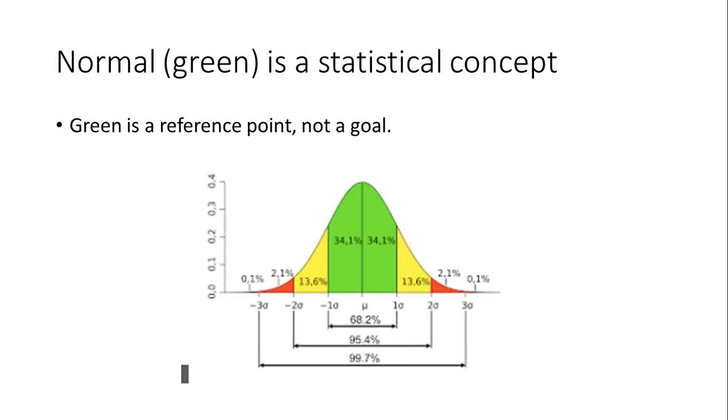We were following BrainDX's example, and we did that for a reason, because BrainDX will be available on our system, and we knew that since the beginning of the system. So this fall you'll be able to access BrainDX norms, which is kind of the gold standard in the field. That was the first map system. But you can see the percentages here: 68% of the population is within 1 standard deviation, and 95% of the population is within 2 standard deviations.